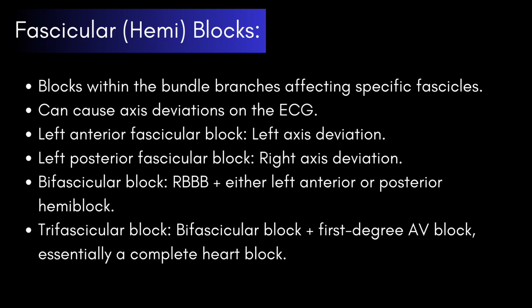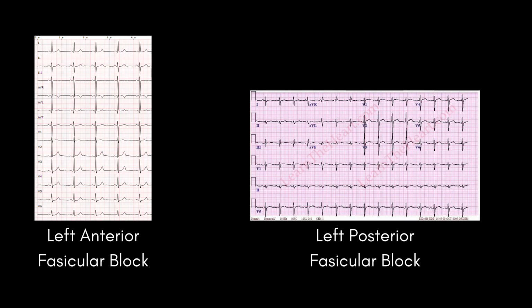All right, here are the visual aids for left anterior fascicular block and left posterior fascicular block. Left anterior fascicular block is often visualized through left axis deviation. Left posterior fascicular block is often visualized through right axis deviation.